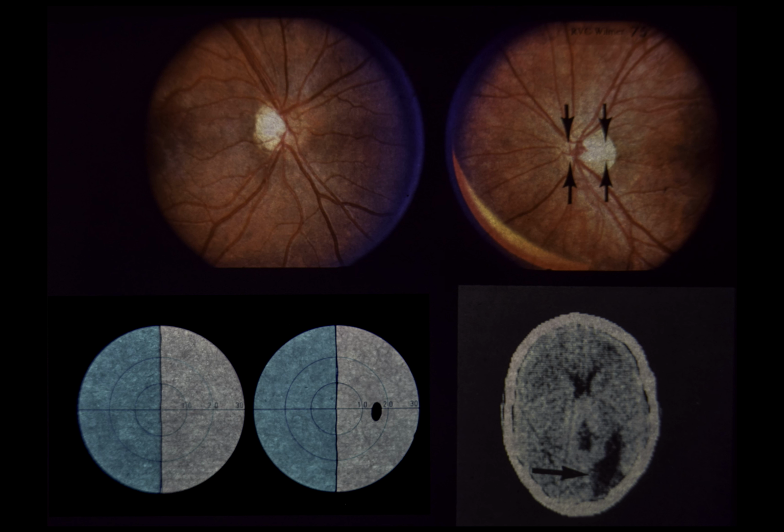Upper left. The right optic disc shows mild pallor, worse temporally than nasally. The pallor is more prominent at the superior and inferior poles of the disc, and no temporal arcuate nerve fiber bundles are visible. Upper right. The left optic disc is also pale, but the pallor is restricted to a horizontal area across the disc surface. Note that the superior and inferior temporal poles of the left disc are normal in appearance, and that the arcuate nerve fiber bundles are easily seen.